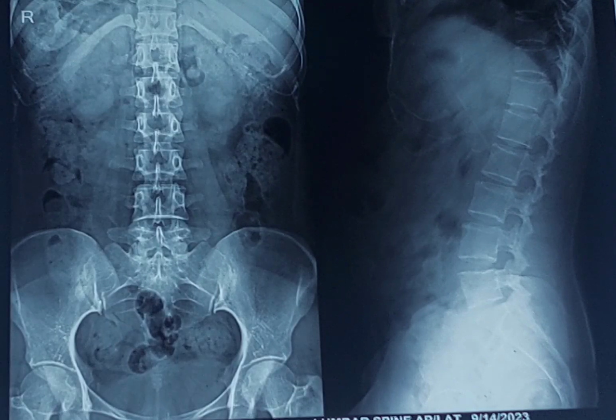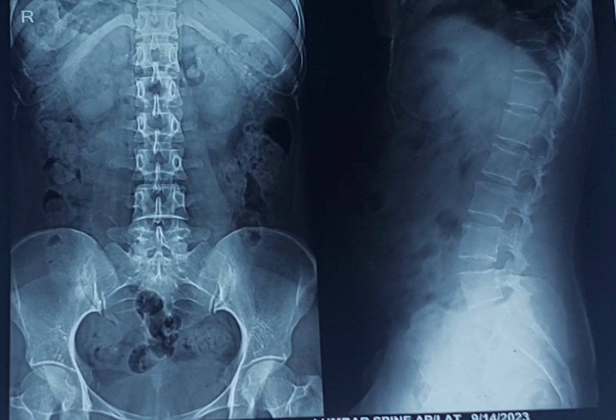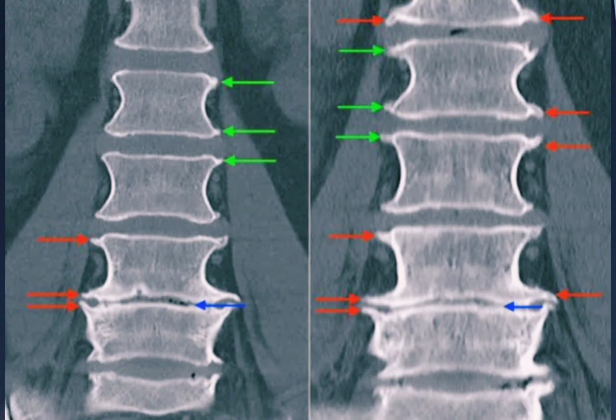Another term we find on the clinical side is spondylosis, and one is spondylolisthesis. What is spondylosis? Spondylosis is a degenerative condition involving the intervertebral disc, and in the X-ray film we can see lipping of the vertebra here, which are called osteophytes.